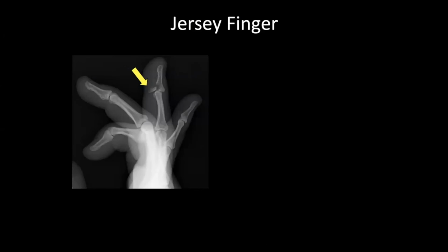And this is what's known as a jersey finger. And not because of the state, but because the mechanism for this is a hyperextension of the digit when it's held in fixed flexion. So you imagine somebody's going to grab somebody's jersey in football or rugby and the tip of their finger gets snapped back, what ends up happening is you end up avulsing your flexor tendon. And so this one has an associated fracture with it. Sometimes it's a pure tendon injury. And the tendon involved is the flexor digitorum profundus, which allows your finger to flex at the DIP.